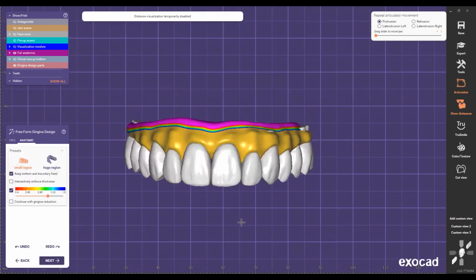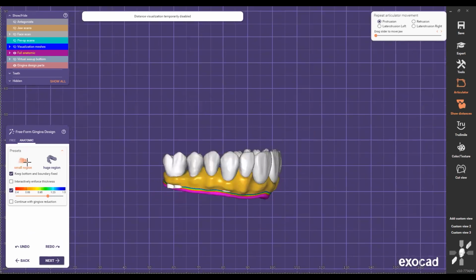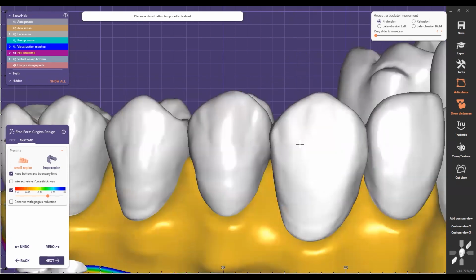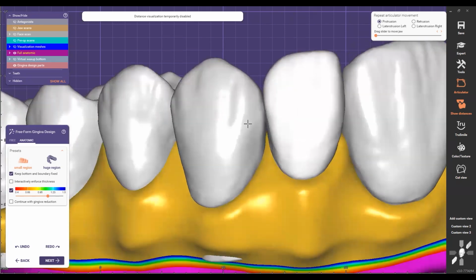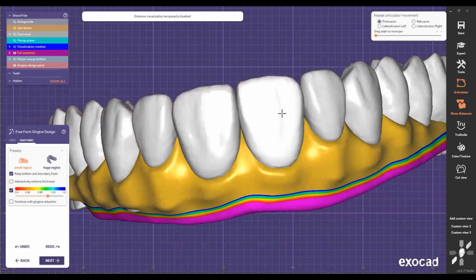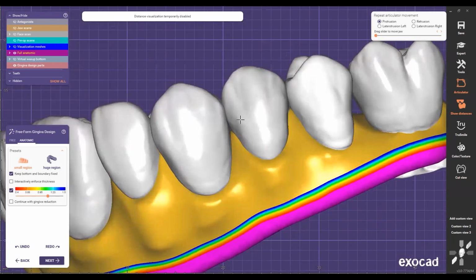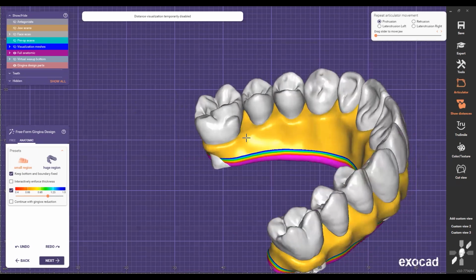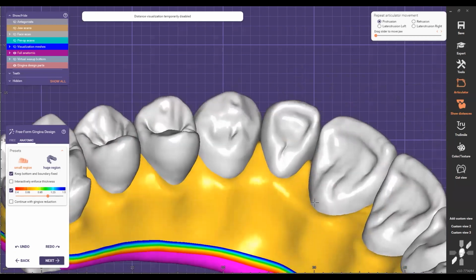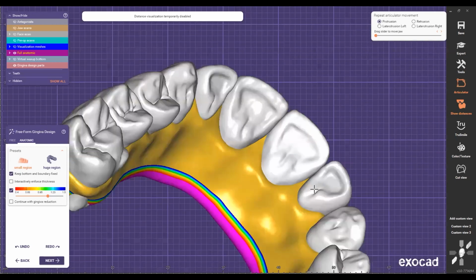Now, from here, the thing that I like to do is, when I see this, I start. I have my protocols. I start pulling, pulling, pulling, so I know what I'm doing every time I'm in this stage. You can see that I was able to close the surfaces on the teeth in the interproximal area, so my design is not going to show too much papilla, too much pink right there. So now I'm going to go here and start pulling those papillas.